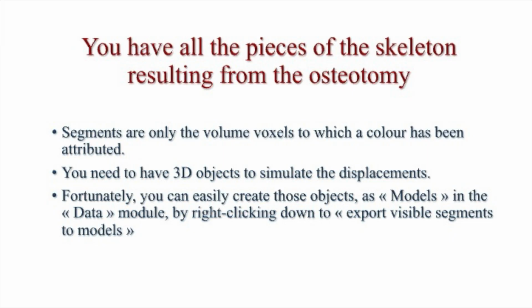Okay, so now we have all the pieces of the skeleton resulting from the osteotomy.